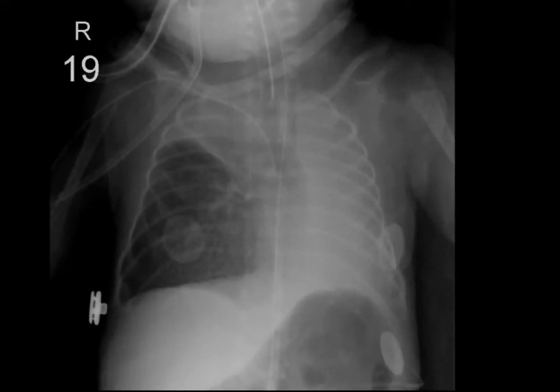This is a patient whose lungs were completely symmetrical just the morning before, and this was an x-ray done because of a change in the respiratory status, and you can see there's complete collapse of the left lung with significant mediastinal shift to the left. There's complete collapse of the right upper lobe, and in this case you can see the minor fissure is elevated, but that's probably because of the tremendous compensatory overinflation of the right middle and right lower lobes.